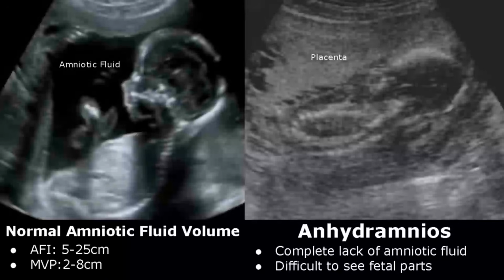In anhydramnios, there is complete lack of amniotic fluid. The placenta is stuck to the fetus and we cannot see fetal parts properly. No amniotic fluid is found.